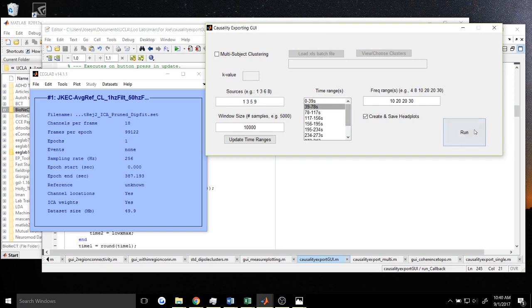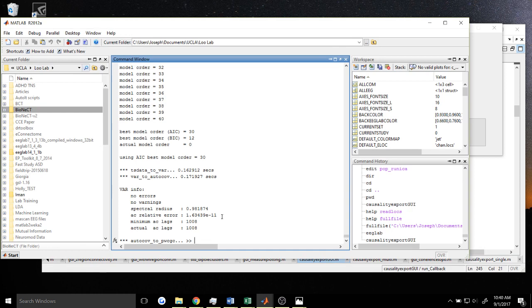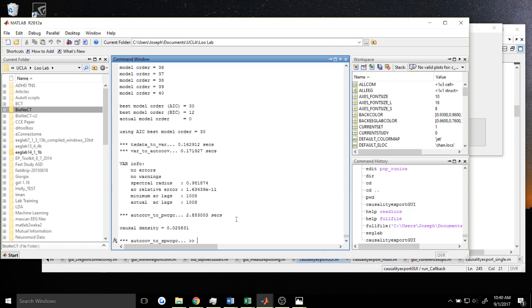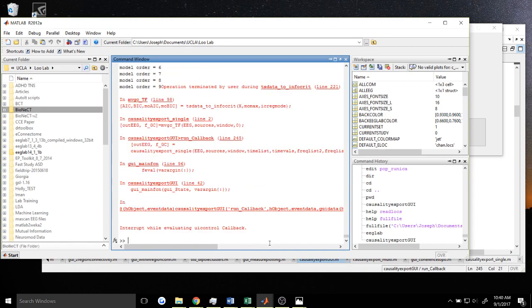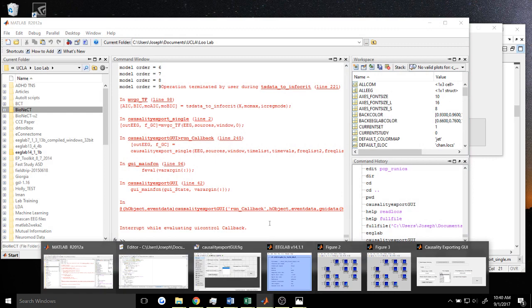After that, we'll just hit run, and the causality will calculate. Depending on your file size, it might take a couple minutes, but for the purpose of this video, I'll just cancel and then show you the outputs that would come out of it.